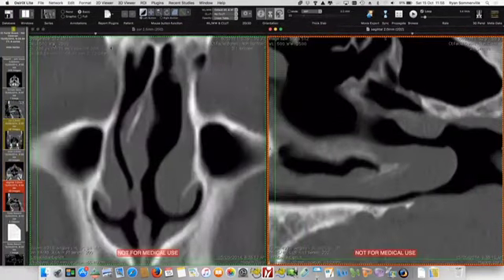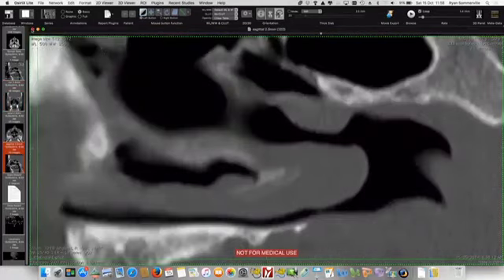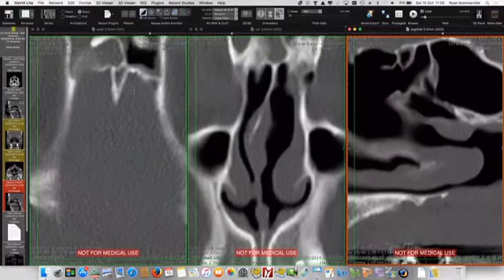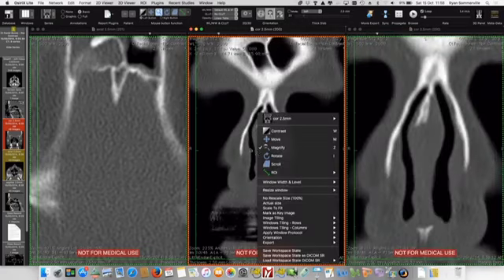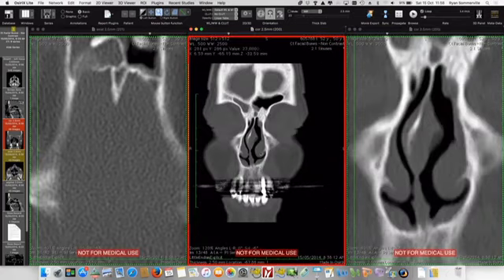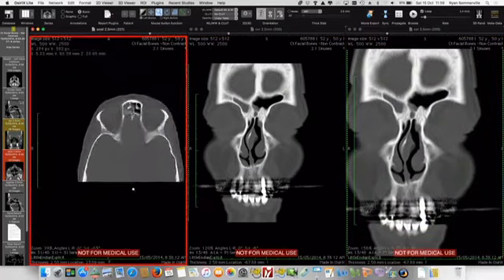That's good. So I'll just start that again. This is great. Okay, I'll just have to... So what I'm going to do is just try and scroll through the cases here. I'll just leave it on that.